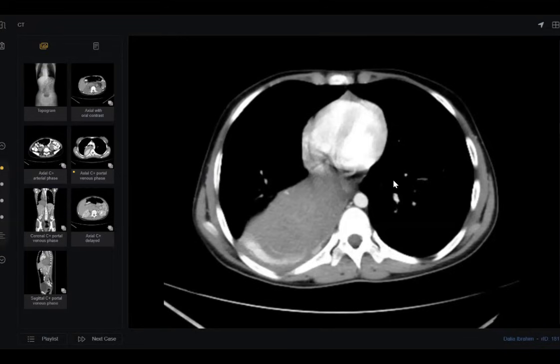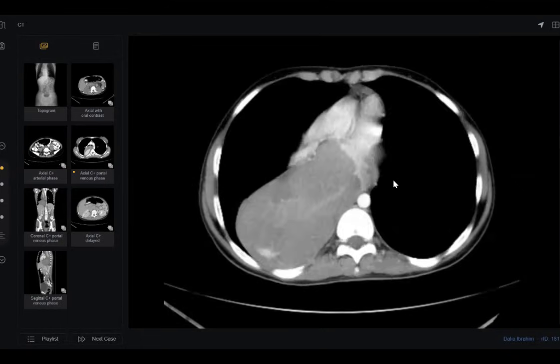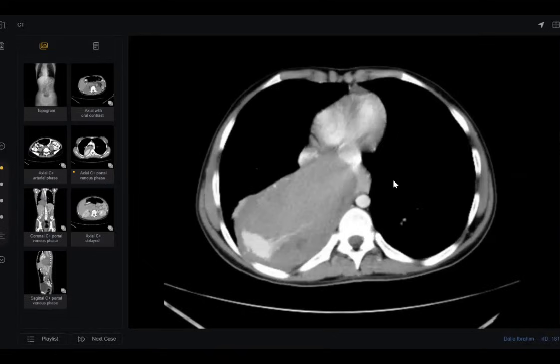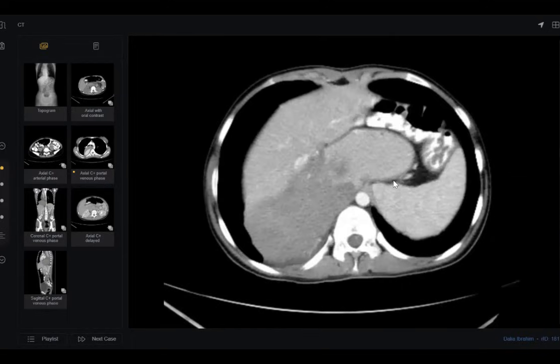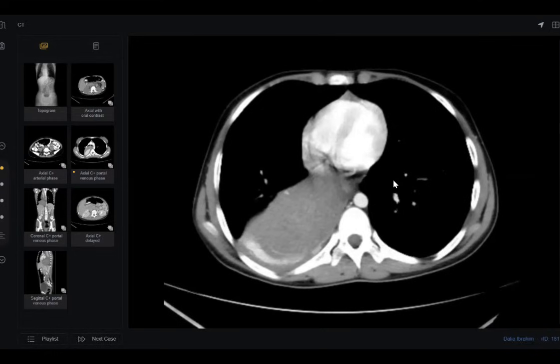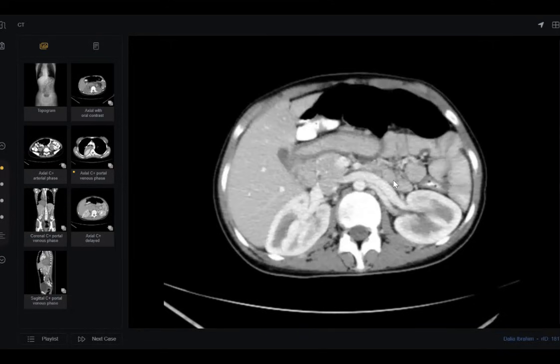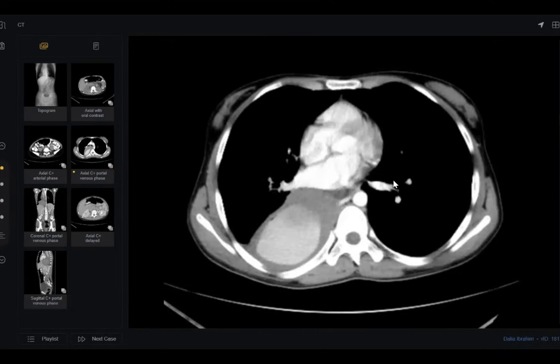Okay. So in my routine practice, Dr. Rami, I want to look at the coronal images to characterize it better, to know the entire extent. Give me some differential. First, if the patient has no operative history, it could be achalasia. Second, I can see that there is some smooth thickening of the wall of the esophagus noted as well.